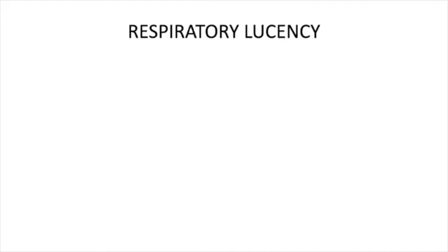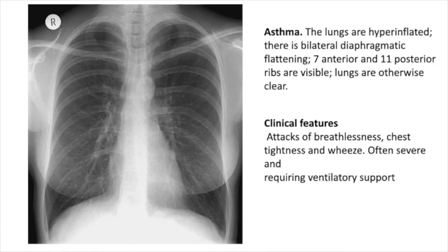Okay, so now let's continue talking about this case about respiratory lucencies. Remember, lucent or lucency. Our first disease, which is very common, is asthma. I know you hear about this kind of disease. What happens in this disease? The lungs should be hyperinflated.